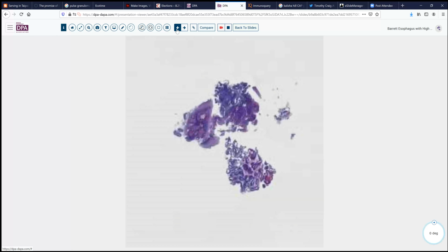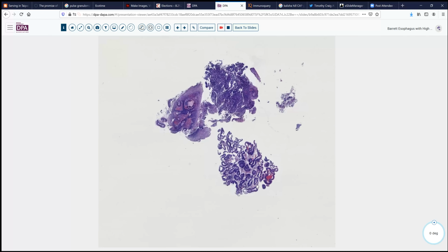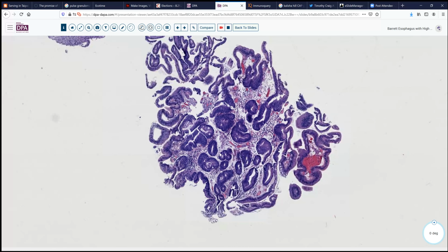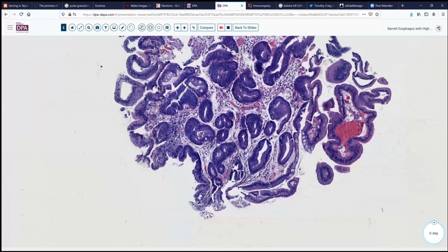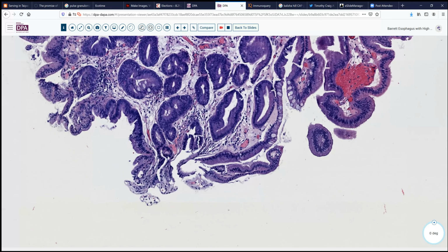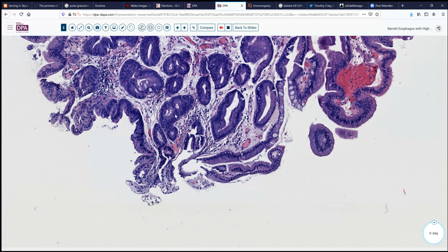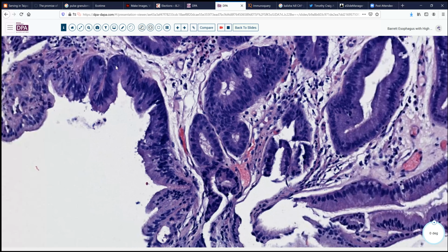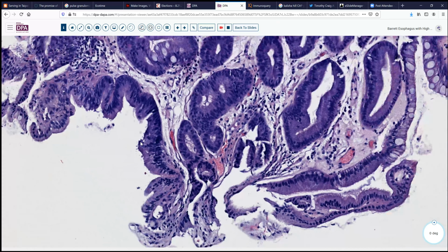So here's another example. Let's test out those criteria in this circumstance. So we have 3 fragments. We see squamous fragment, and then we see this fragment, which has clear-cut intestinal metaplasia. So do we have surface involvement? Well, it looks as though here we're a little bit hyperchromatic and a little bit stratified on the surface. We may have some nuclear pleomorphism there.